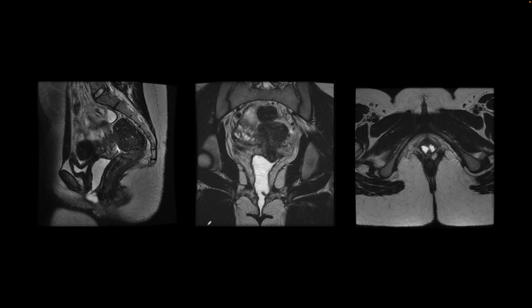This is our next patient. We performed an MRI of the pelvis in a young female. So we have small field of view, sagittal, coronal, and axial images. Here we have distended the vagina with ultrasound gel. So this is the vagina, and we see a vaginal septum right there on the coronal and here on the axial. So vaginal septums are not very common.